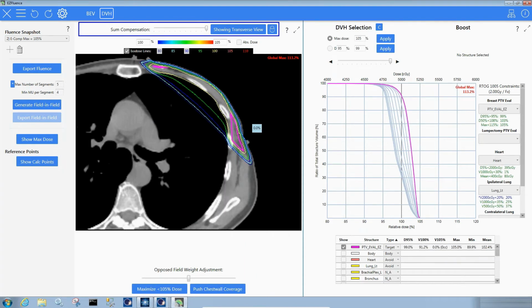You cannot do separate prescriptions in an all-in-one. You can only do that in a superclav, in a plan sum workflow. You could potentially just separate the plans out in your all-in-one and adjust your prescription as needed. But if you want to do this workflow using different prescriptions, this is the workflow you would use.